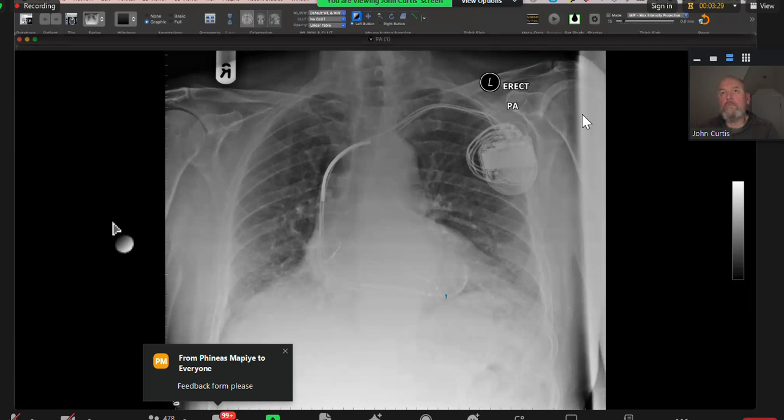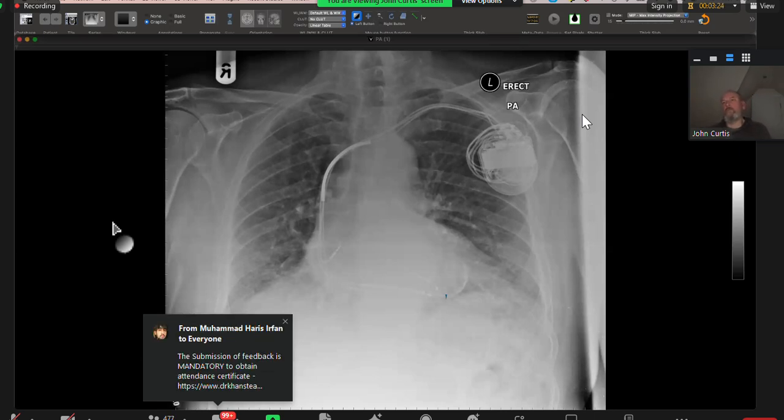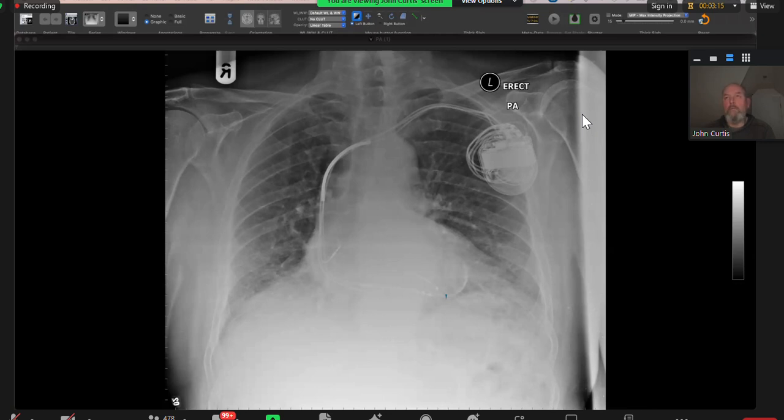And the patient had a stroke. Okay, and there's slight airspace shadowing noted in the bilateral basal segments. So over here, and this over here. So it could be a case of aspiration pneumonia. What can you see on a chest X-ray that might be implicated in a stroke? Patient could aspirate, so the patient could have an aspiration pneumonia. Yeah, good. That's very good. Well thought.